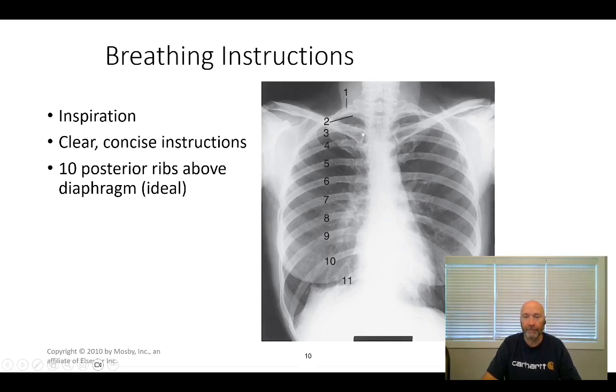And what we're going to look at for rotation are the clavicles and their proximity to the spine too. The clavicles are your collarbones, and they're here. Your spine is back here. The two don't touch, but on this two-dimensional representation of the patient's anatomy, they look like they do. So what we're going to look for is symmetry here to determine rotation.